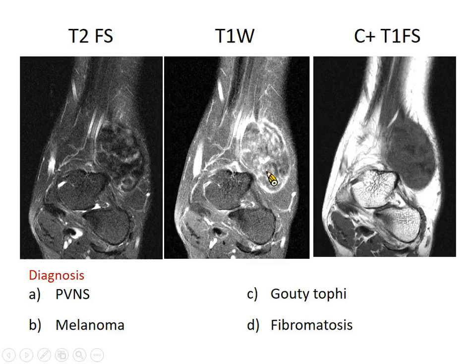But in terms of fibromatosis, usually the low signal is rope-like, like this. It is not like the fascicular sign, pepper-like in schwannoma or peripheral nerve sheath tumor. So those are fascicular signs with pepper-like low signal intensity spots.